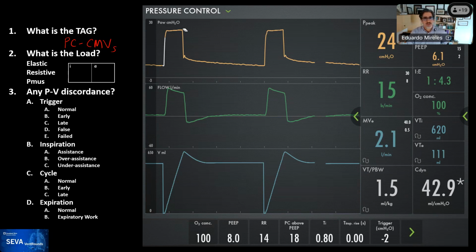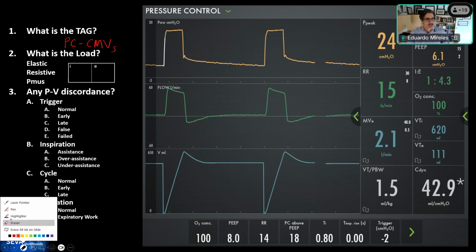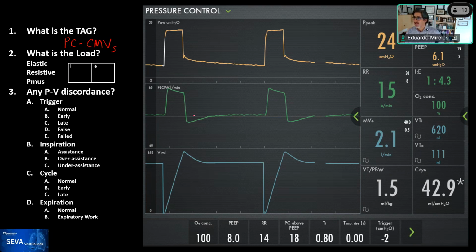And set point, because the person that set this ventilator, you can see here, the operator set the inspiratory time as well as the pressure above PEEP that the patient is receiving. Rob, anything on the tag? Just to say that there's no tidal volume target, so you know it's not adaptive targeting at set point. Perfect. So not volume control, not adaptive targeting either. So perfect.